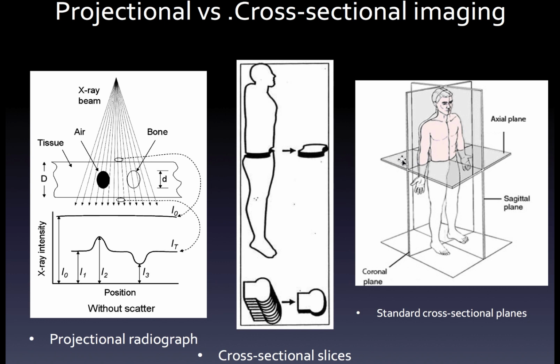When we CT scanned your cadavers, we went from head to toe using axial images, which is this plane right here, the axial plane. We are going to also examine images in the sagittal plane, which is this plane right here, and also the coronal plane, which is this plane right here. It's important for you to know which orientation each of these planes is: axial, sagittal, and coronal.